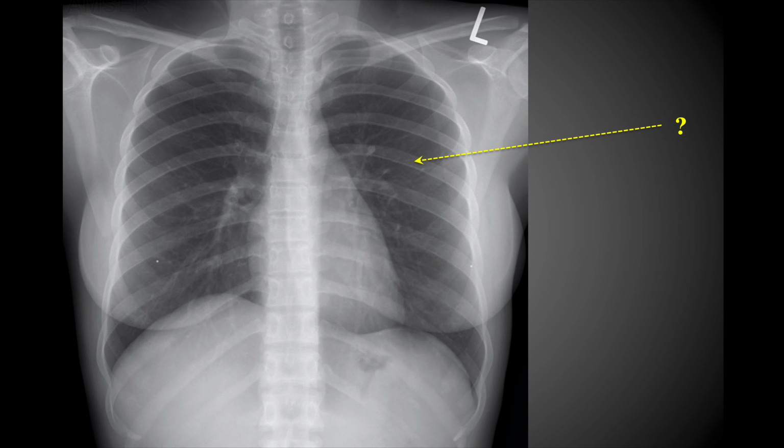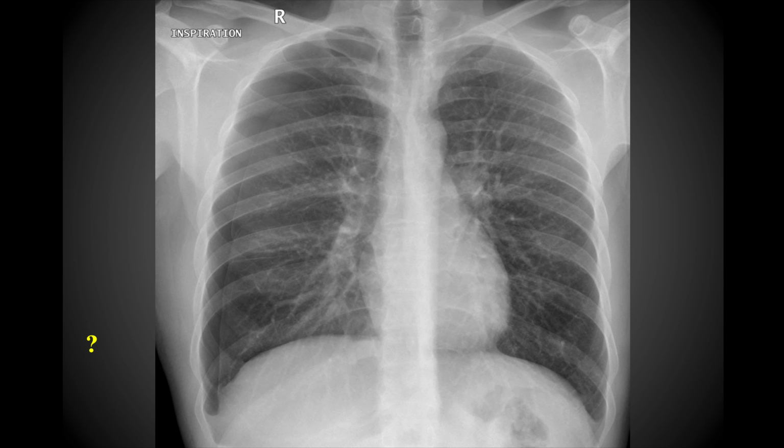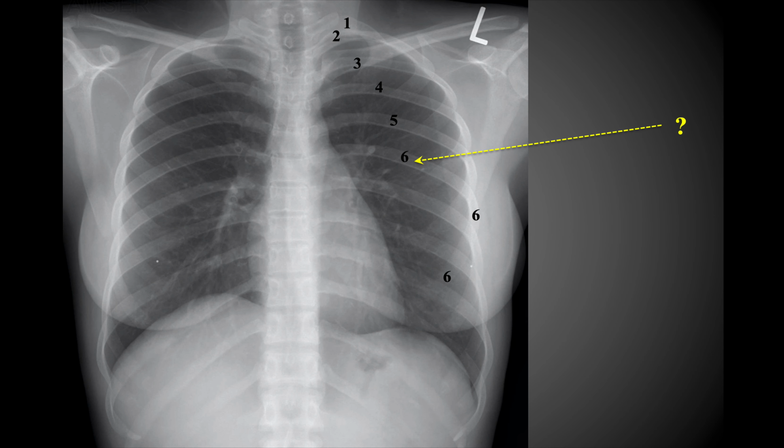All right, so I just wanted to review a couple of x-ray related images here, since there were a couple of issues that came up on the quiz this week, the quiz from Thursday. So just to review the counting of the ribs, make sure that you're able to accurately count both the posterior ribs in this case, as well as the anterior ribs, as you see down here with rib 6.